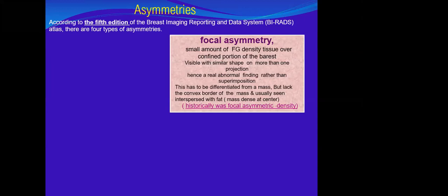So it is more similar to a mass and should be differentiated from a mass.